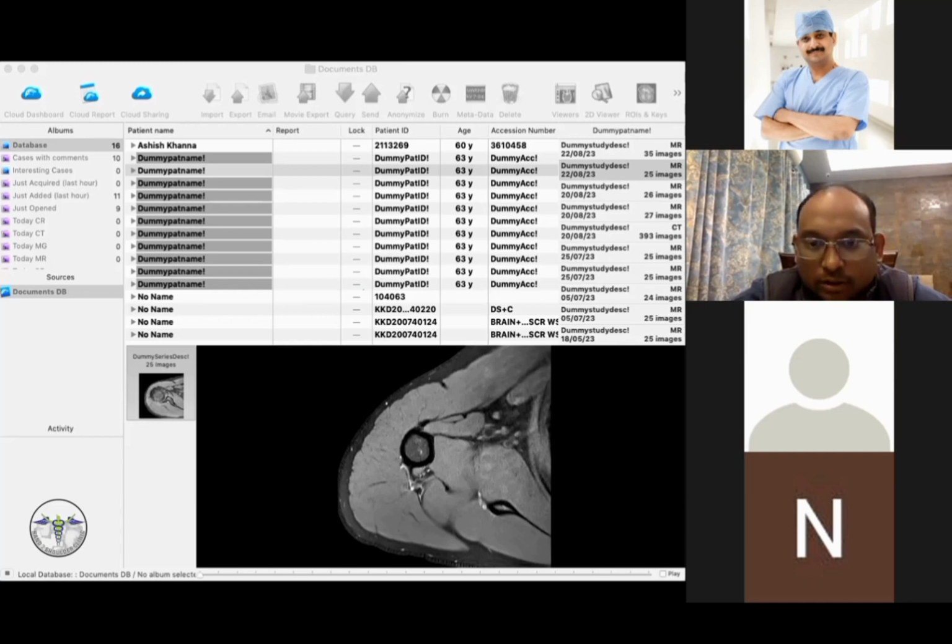Previously, for bone loss, people relied more on CT because advanced MRI machines and sequences were not there. I showed the CT just to show how bone loss looks in CT, and incidentally the CT was done before the MRI, from a different institute.